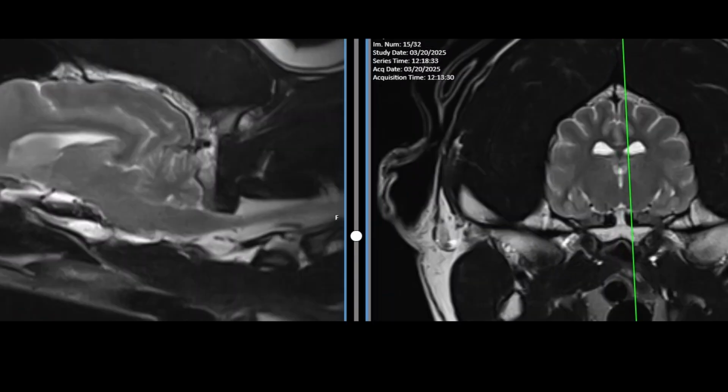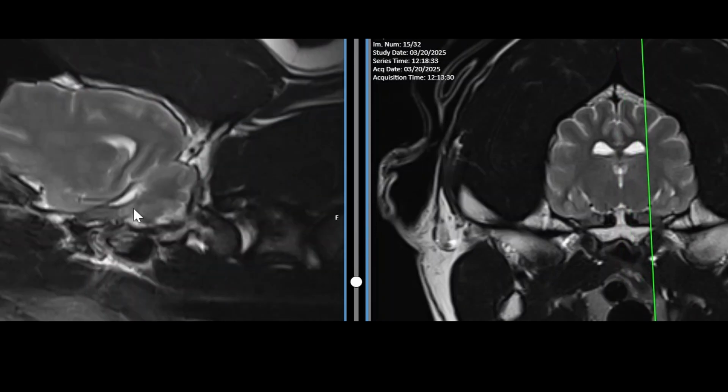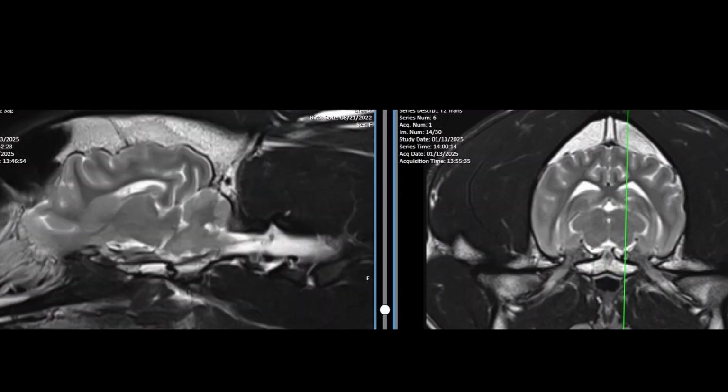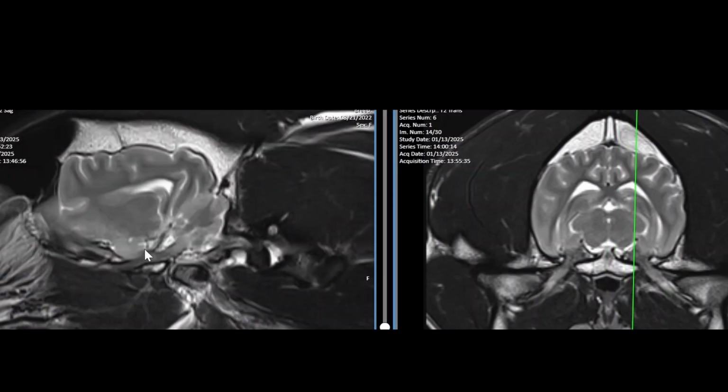Now we want the mandibular, a harder nerve to see. So first we have the maxillary and ophthalmic going forward. The mandibular is curving ventrally, medial to the tympanic bulla, coming out of the oval foramen here. And actually, we generally don't see that nerve very well unless it's diseased. And here's an example of a diseased one. So there we have the nerve root going rostrally and then coming down as the mandibular branch. And look how you can really see that nerve because it's so thickened in this particular case.